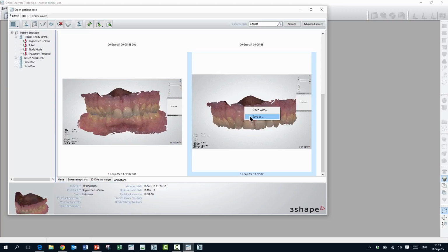The final thing I want to show you is how you control the length of the animation file. The Ortho system ships with an animation length of 10 seconds, no matter how many steps you have in an animation file. I'll show you where you can change it, and you probably guessed it's in the control panel. Let me just open that right now.